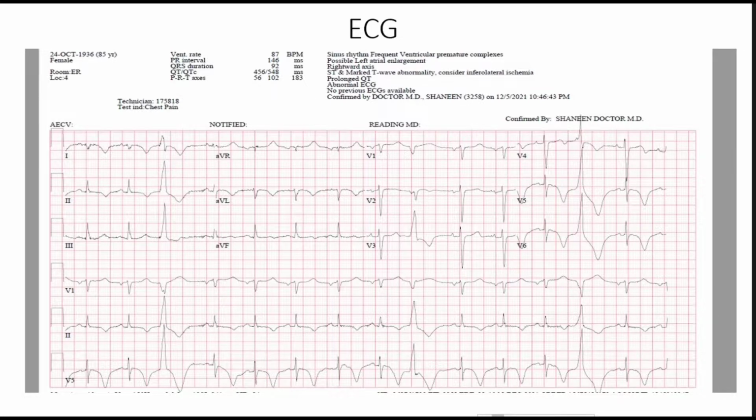Any comments about this? It's not particularly the cleanest EKG, but she's having some ectopy, some premature ventricular contractions that you can see throughout the EKG.